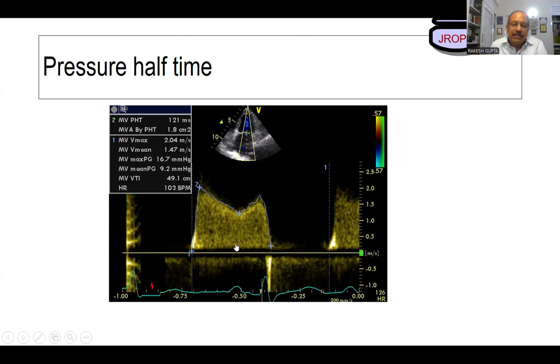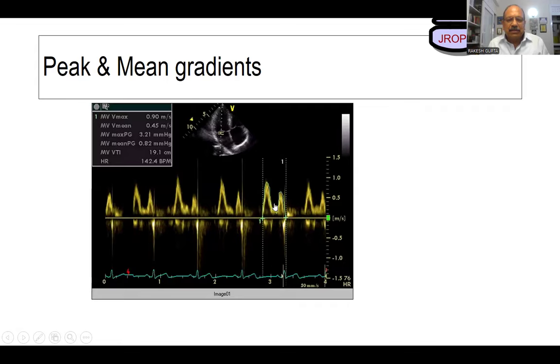So what we learned is, put a sample volume across this Doppler flow pattern. In a normal subject, when there is no turbulence, no aliasing, you will find this kind of pattern. Look, the initial emptying would be there. Gradients, this is mitral valve. What is the maximum velocity, remember? 1.3. Remember two important velocities, mitral 1.3, aortic 1.7. Half of mitral is tricuspid, half of aortic is pulmonary.